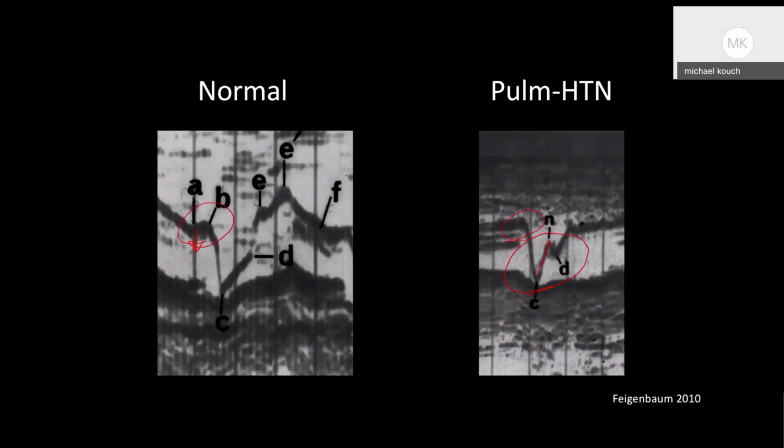So there's a couple different possibilities. If a patient has pulmonary hypertension chronically, their pulmonary artery is going to be big and dilated, right? And those valves don't go all the way outward to the end of the artery. They kind of get stuck in the middle of it, and they start to float back, okay, into the midline, and that's where this area is coming from. And that's what most people think is probably what's causing it. And there's turbulent flow in this region, causing the valve itself to flutter in the middle of systole coming out of the right ventricle, right?